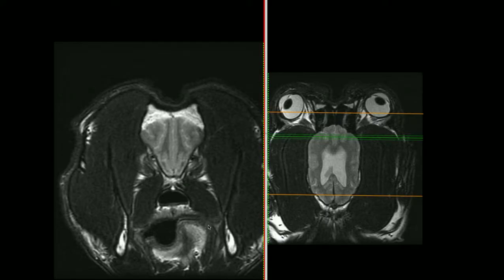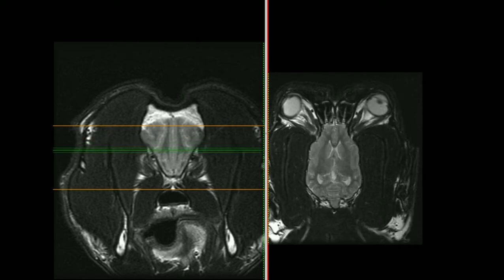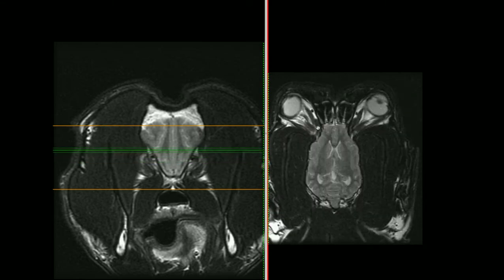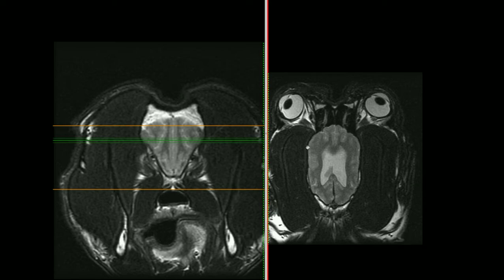So this is the MRI, and for ocular and orbital disease, dorsal plane images are often very helpful. On the dorsal plane first, we're looking for any asymmetry in the orbits, things which might result in abnormal ocular position or involve the nerves and muscles which supply the globe. Here, this is right, this is left. Initially, on a superficial glance, the orbits look fairly symmetrical. The variation in eye position is just due to general anaesthesia, so we can't really infer anything from that.